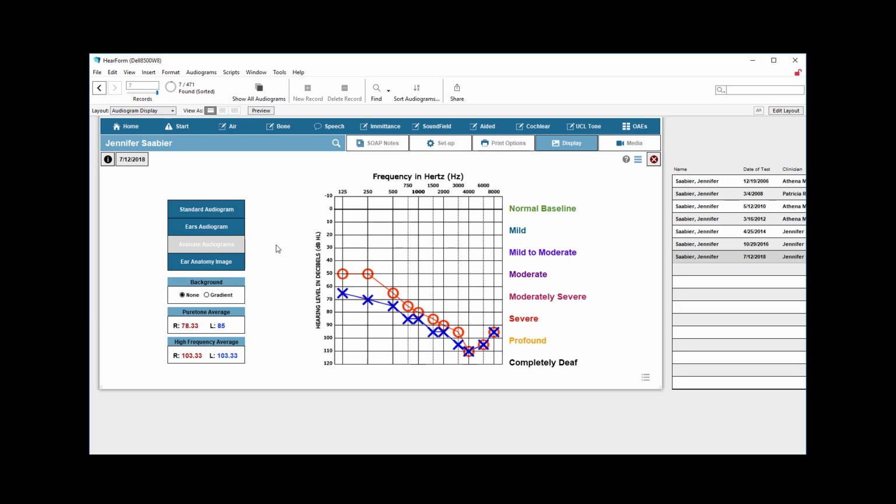You can also use the wheel on your mouse to click up here. I said wheel on your mouse, I'm sorry, the pointer here to click back and forth here, and that will cycle through the various screens slowly if you don't want to use the animated part there.